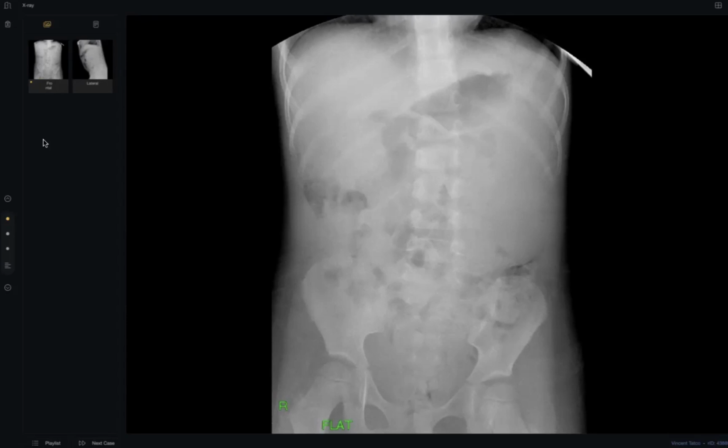It's displacing bowel loops inferiorly. Apart from this density, I can't appreciate any calcification within it, and there is no air lucency or low density within it. So I'm suspecting a mass lesion overlying the left renal area. I want to further proceed with this patient with an ultrasound.